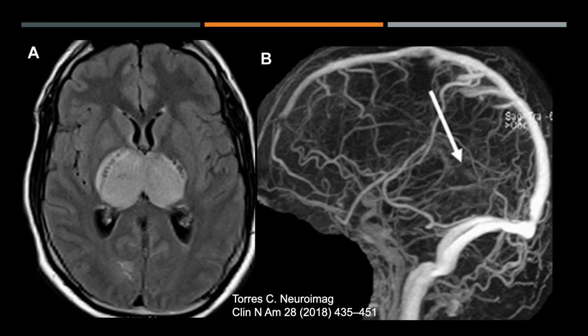This is a venous infarction. Again, straight sinus, vein of Galen, internal cerebral veins thrombosed. Remember to think about venous infarction, especially the unusual situation where you have deep venous thrombosis.